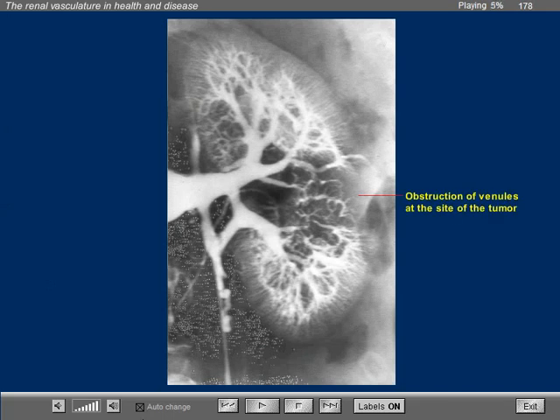This is a selective left renal phlebogram of the same patient. Note the very extensive area of the left kidney that could not be suspected on the arteriogram. So the phlebogram is more sensitive for space-occupying masses that are small and do not elicit significant neovascularity than the arteriogram.